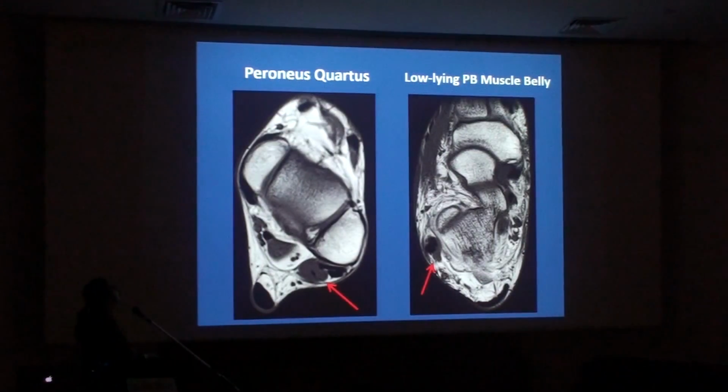Also, some other anatomic variants, such as Peroneus quartus, which is an accessory muscle seen in the retromalleolar region, which typically originates from the Peroneus brevis and has a variable distal attachment site, most commonly at the retrotrochlear eminence, can cause crowding in the retromalleolar groove and subsequent injuries of the peroneal tendons, in particular the brevis. And you can see over here, and also this could be asymptomatic. So this is the Peroneus quartus.